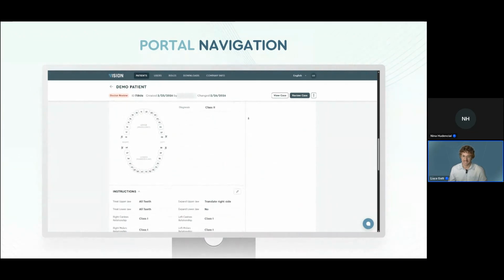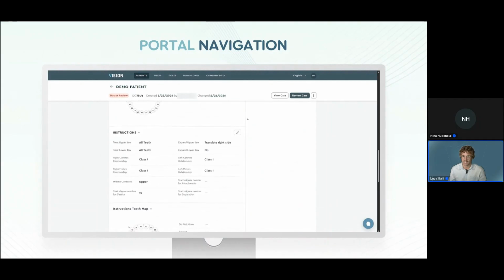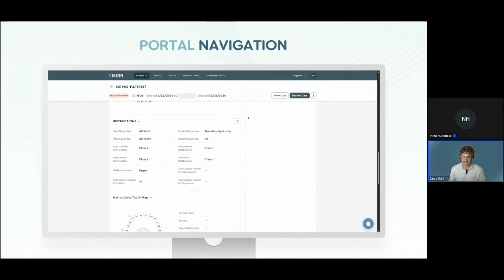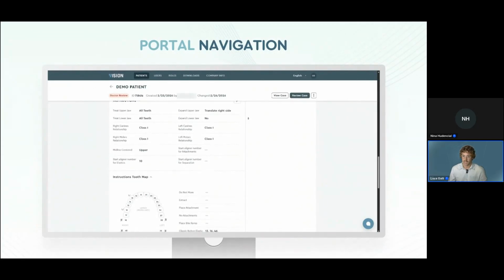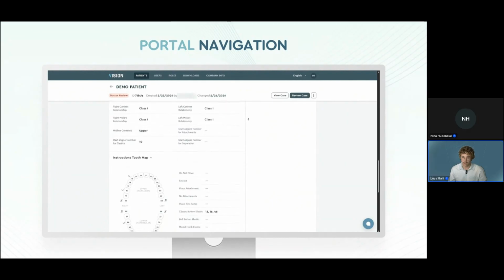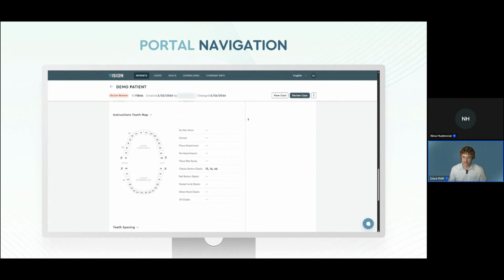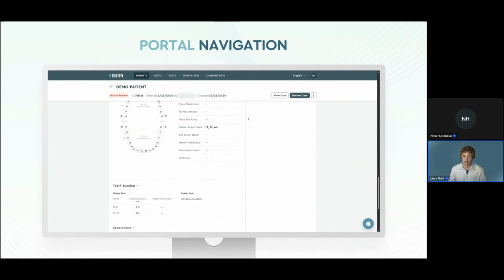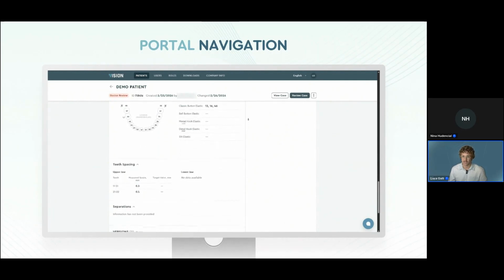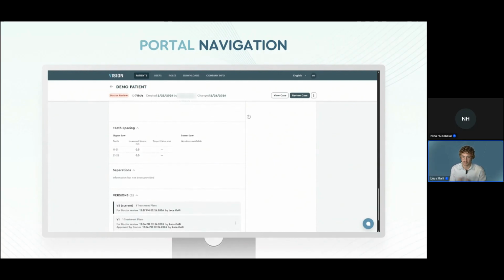I can explicitly state, for instance, that the third molars were extracted, specifying my target class 1 molar and canine goals, midline centering, and precise elastic or expansion protocols, where and when I want auxiliaries, and many other things. A highly useful feature also is the spacing tool, which allows us to measure and communicate small interproximal diastemas that intraoral scanners sometimes just close up.